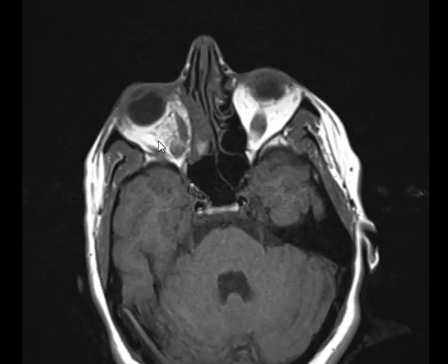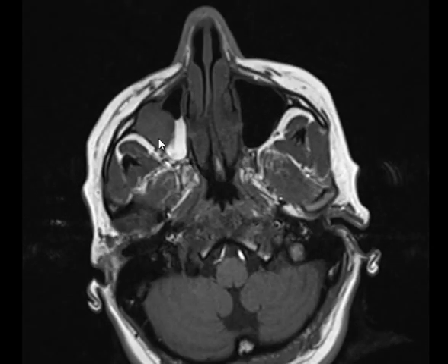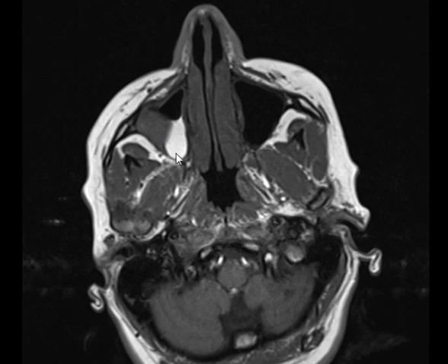First of all, let's start inferiorly. Is this normal? There is a fluid intensity inside the right maxillary sinus. Is the fluid hyperintense on T1? No. So what's this? Maybe fat, maybe blood. Good. It can be fluid, soft tissue. Okay.